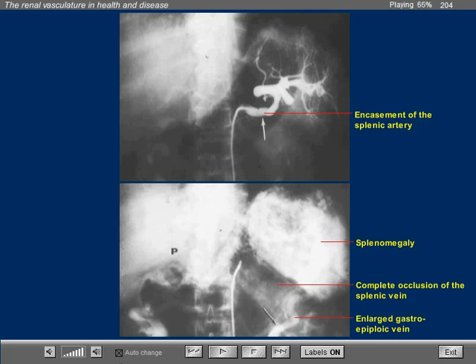So in the presence of a splenic vein obstruction or of the left renal vein, one has to think of pathology of the pancreas. At surgery, this lady had an extensive cancer of the pancreas, which was not clinically suspected. We are omitting the CT examination that revealed a non-resectable tumor of the pancreas.